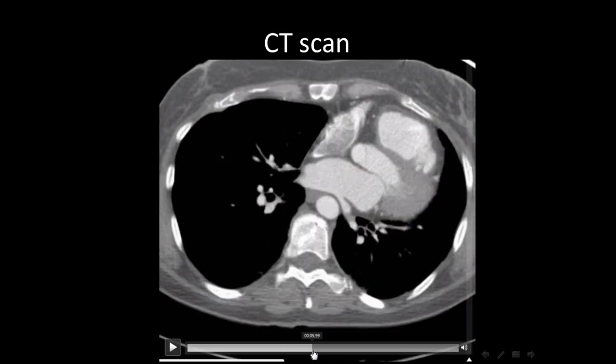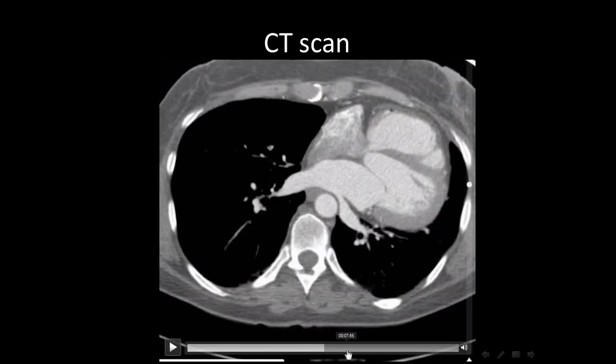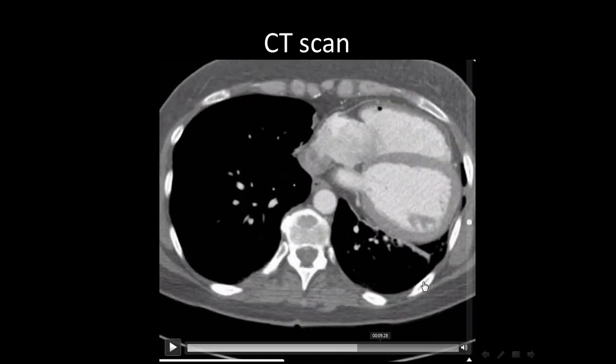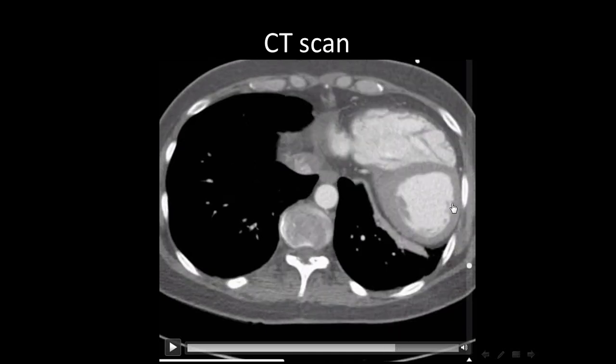So what is the normal location of the heart? No. This is the sternum, right? Yeah. Usually the heart should lie posterior to the sternum, within the middle. Yeah, it's deviated to the left side. Yeah, true. So there is a levoposition of the heart. This is first. Second, the apex of the heart, which is the lowermost end of the left ventricle, is lying posteriorly. So there is posterior location of the apex.